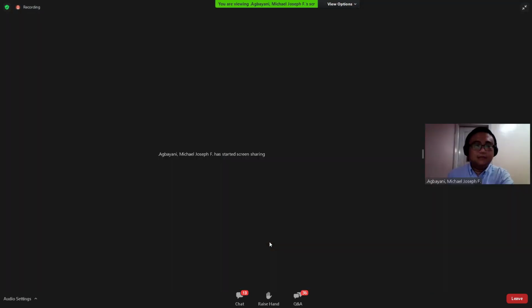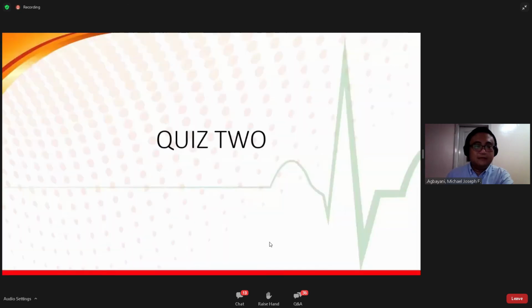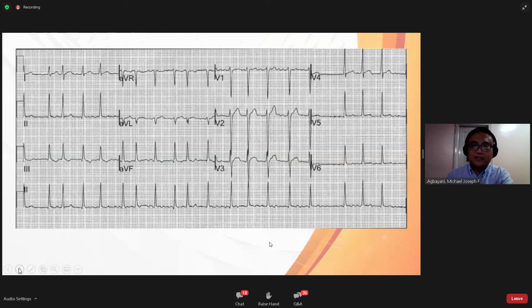Okay, welcome to the second ECG quiz for today. I'll share my slide. This is quiz number 2. What you see here is an ECG. Take a look at your ECG first before we go to the question. Actually, this is a very good example of the answer.